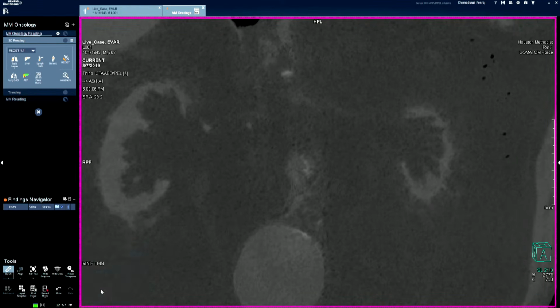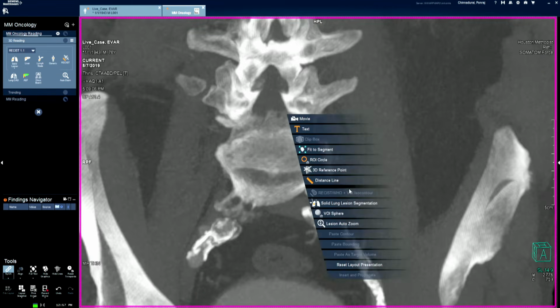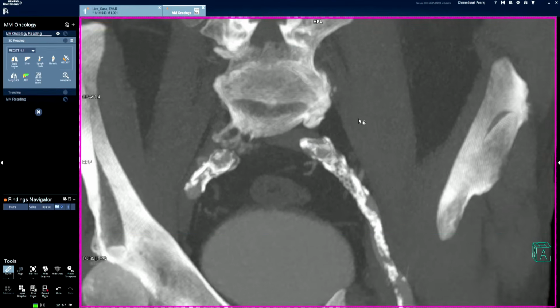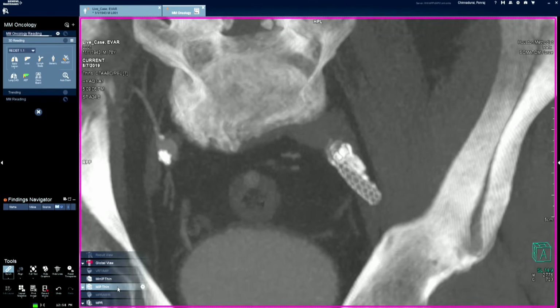We often use what we call maximum intensity projection to look at calcifications, because those have the highest density values, or to look at stents, which we very clearly missed when we were looking through the axial views. And are they always setting the depth of the MIP? Yeah, so we can custom determine. Right now, it's always with respect to the slice you are currently in.